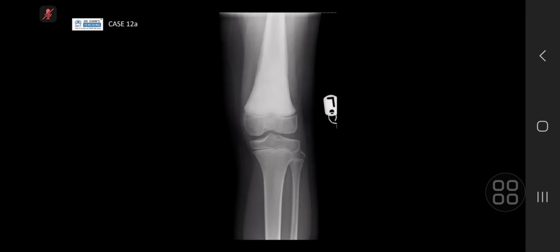my differentials would be. Before you get to differentials, can I stop you and just think about whether you can see any aggressive or non-aggressive features? I am not able to differentiate whether this is a lucency beneath the cortex or a periosteal reaction. So I would say it is a periosteal reaction and attribute it to an aggressive feature of the lesion. Okay. Is there anything that you would like to know about this patient before you start to give a differential?